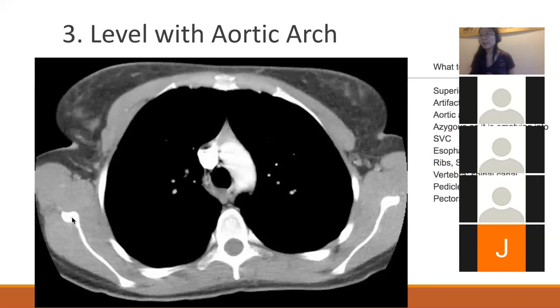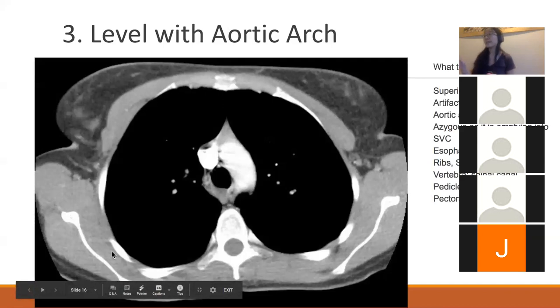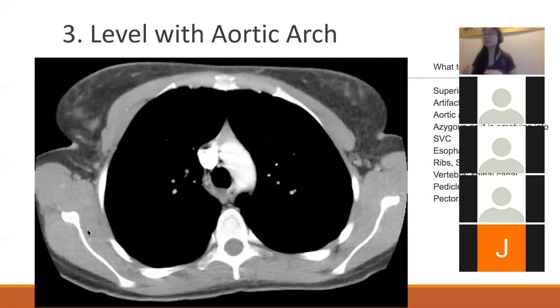Another thing to keep in mind is that we see the scapula again here, right? This time, we saw the spine in the last slide, so now we are below that spine and we're getting into the rotator cuff muscles below the level of that spine, right? That would be your infraspinatus, your teres minor, and your subscapularis.